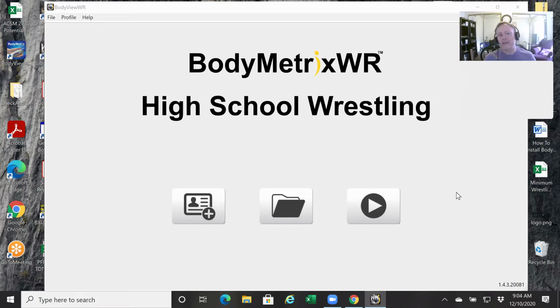The BodyMetrics system is really easy to use. There's a few things that you want to be dialed in on, which I'll discuss. I'm going to cover various case scenarios that may occur during your assessments with your athletes. But without further ado, I'm just going to jump in.